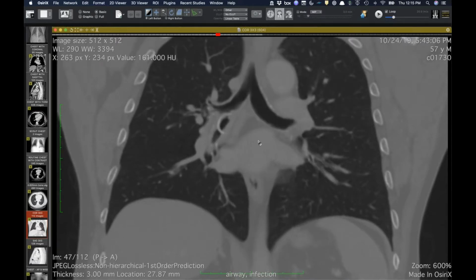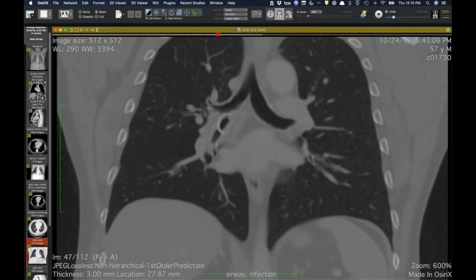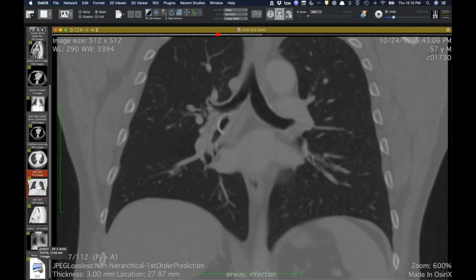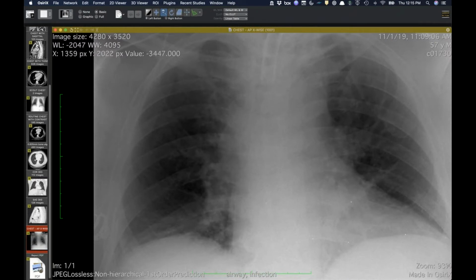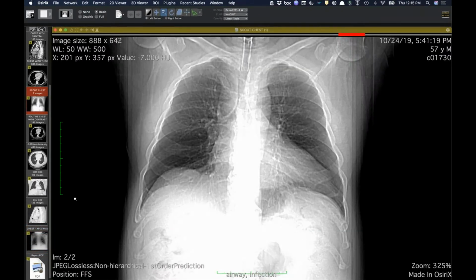Huh, but it's hollow in the middle. It is hollow in the middle. And the other thing is, it's not metal, because you don't see it on the radiograph. Yeah, and it's more like, as you're saying, cartilage or bone.